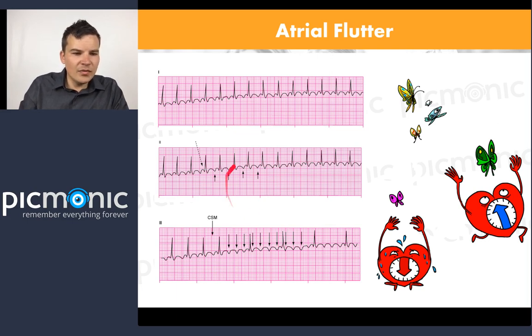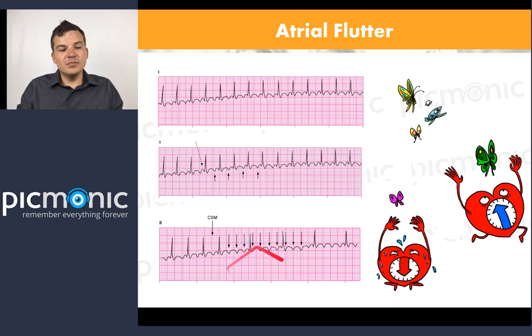Here's a 2-to-1 ratio. Here's a 3, and then a 4 to 1 ratio. So you can see the difference there and how the cardiac output is different, and how you'd have problems with cardiac output if you had 4 to 1 versus 2 to 1. And that's absolutely right, because you would have a lot decreased blood flow.